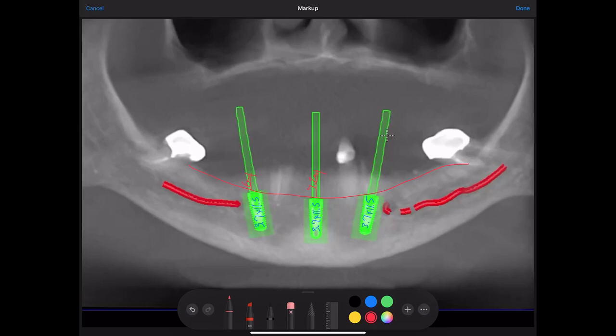And then just distal to that broken off tooth is going to be 6.8 millimeters. So this will be pulled up on the screen at the time of surgery, or one of the monitors in the operatory, and it will allow the team to see exactly what the plan is going to be. That helps them with setup and helps them just know what's going on during the procedure.